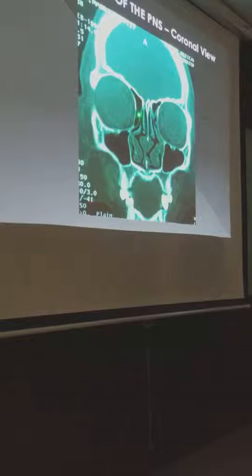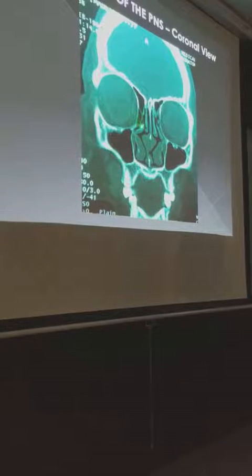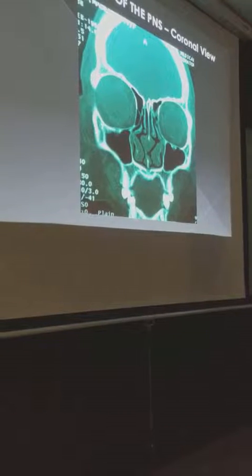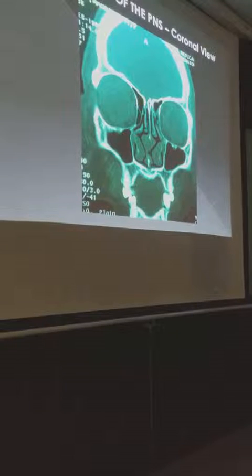Okay? So if this is now the ethmoid bulla, ano ngayon ang relations niya? What would be the cell above it, this space?